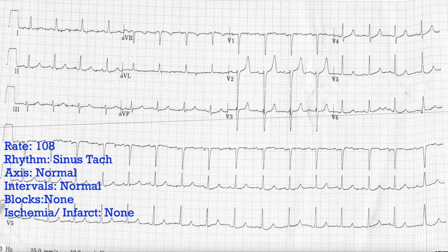And again, the note that was sent with this EKG just said potassium 8.1. That is, of course, a laboratory diagnosis, but the EKG certainly suggests it. One can imagine all sorts of different scenarios why this person's potassium may be up. One of the more common reasons, of course, is end-stage renal disease and dialysis and that sort of thing. But if you're handed this EKG, your first thought would probably be, I wonder what that potassium is. And if the person became unstable, I would certainly act on that EKG and go with some calcium.